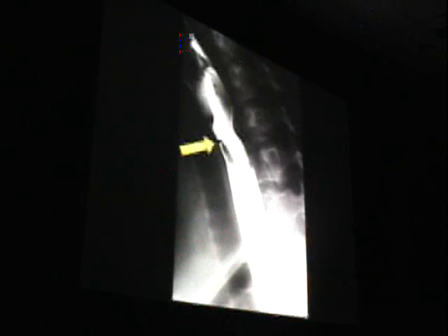Here's an esophageal web, and it's hard sometimes to tell exactly where this is. This also could be a pharyngeal web. But you notice the little teeny tiny air bubble just beneath it is kind of a marker. These are clinically significant, and by the time the patient has an endoscopy, basically they're treated because the endoscope will break these webs up. And unless these are circumferential, they rarely cause symptoms.